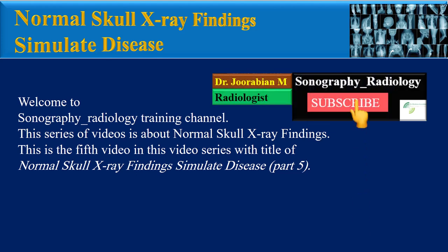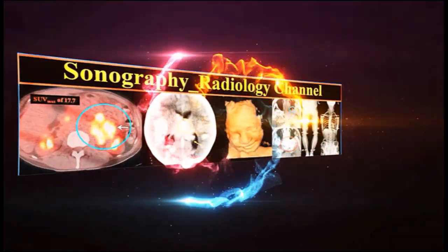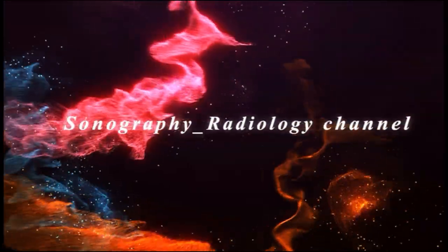This series of videos is about normal skull X-ray findings. This is the fifth video in this video series with the title of Normal Skull X-ray Findings Simulate Disease Part 5. Like previous videos, we will review a few cases together.